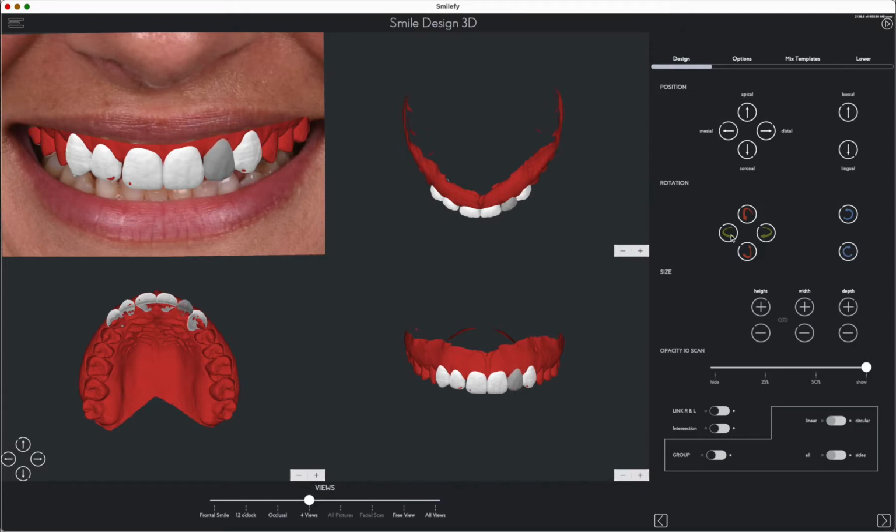Of course, the 3D smile frame is going to be more and more precise, more and more accurate, so that if the 3D smile frame is set correctly and as accurate as possible, we don't need to readjust the smile. We're going to get an accurate result.